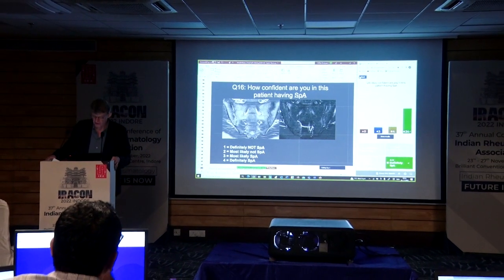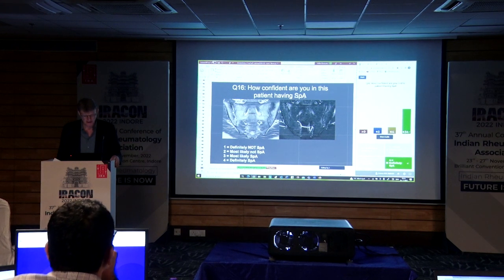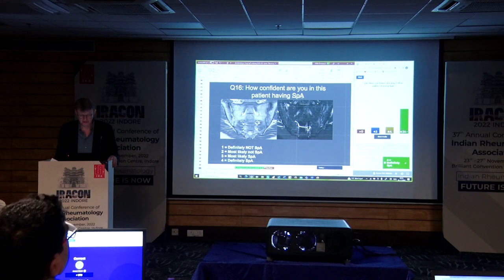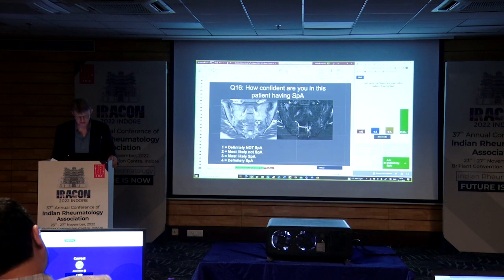Right, and I fully agree that this is actually SpA. First of all, based on the fact that I showed you the erosion, I showed you the backfill, and in reality there's more. There's some bone marrow edema here and there as well, and there is ankylosis down here. So it is actually SpA, for sure. You have many different signs.